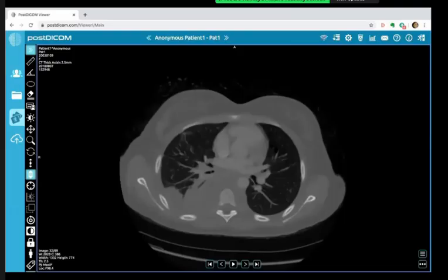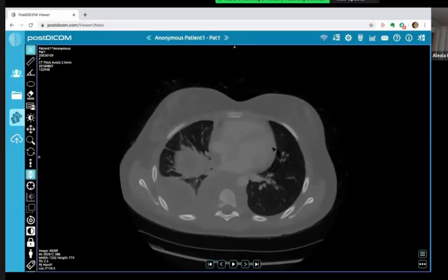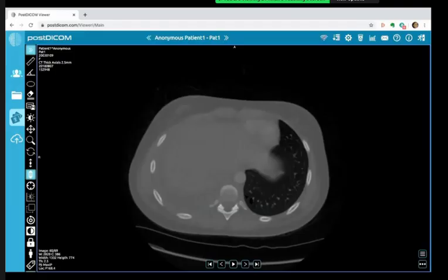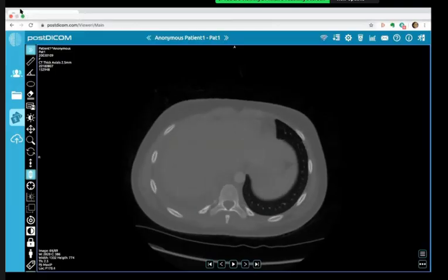Can you think of an organism which likes to do this? Particular organism? Staph aureus? TB. TB, okay. Paraspinal abscess, empyema, and bone erosion. Great.